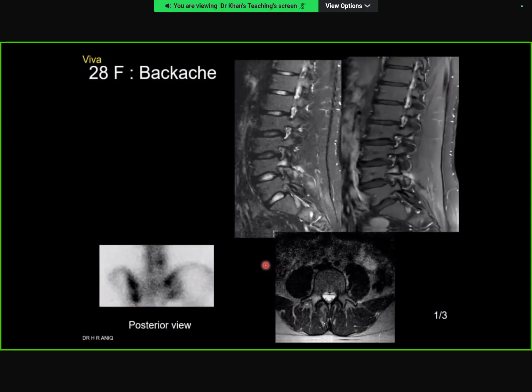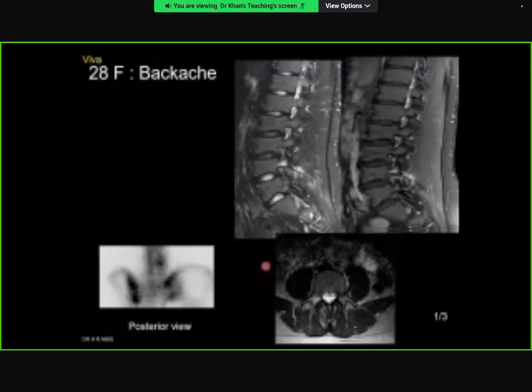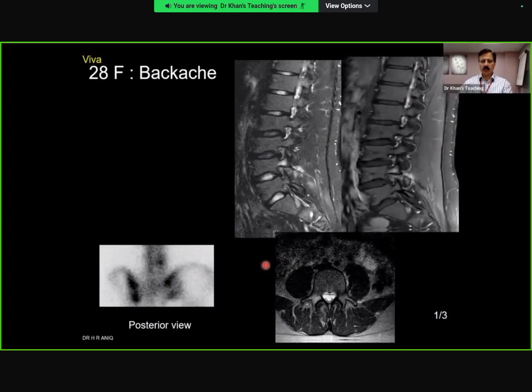It could also be post-traumatic change, so maybe like a pedicle fracture. So which kind of pedicle fracture again? You remember? Like a pars defect, sorry. Yes, pars defect. So please remember, just like your tibia here, the main savior for you is the CT scan. And this is another scenario in your exam where you're going to ask for a CT scan.